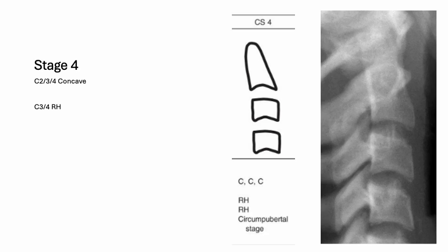They're starting to occupy this trapezoidal shape, which can make it kind of confusing. But if you measure it out, both of these look to be fairly rectangular horizontal. You can still see the ring apophyses actually on C2, 3, and 4 in this example as well. And the uncinate process is sticking up above the superior end plate, but perhaps not so much as in the younger examples.